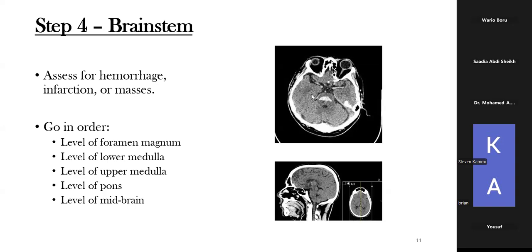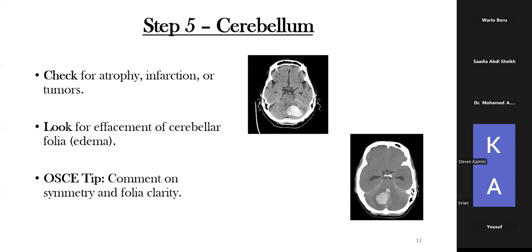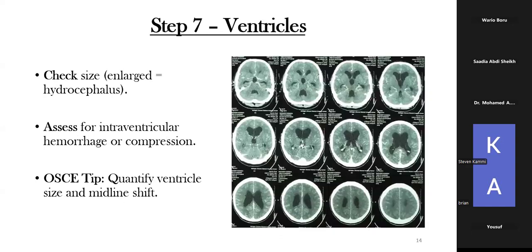So what happens with that is you need to be able to see the vessels. Like you see, this is a non-contrast scan. You cannot tell any of the vessels. You cannot see any of the sinuses. If the sinuses are lighting up, which is the superior sagittal sinus, inferior sagittal sinus, the temporal sinuses, etc., you'll be able to see that's a contrast scan.